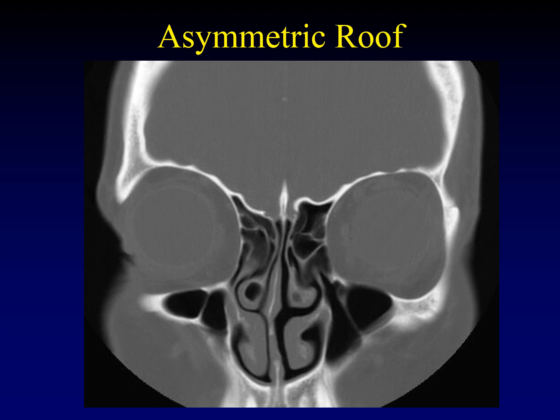Another important thing to discuss is how shallow or deep the cribriform plates are. That is, how much distance is there in the lateral lamella. You can see on this side there's essentially no lateral lamella, so that's a shallow cribriform plate. How shallow does it need to be? Well, there's a little bit of subjectivity here. If you want to be more objective, you can use the Keros classification scheme, and your cutoffs here are less than 4 millimeters for a shallow cribriform plate, greater than 8 for a deep cribriform plate, but I find that the subjective analysis is usually sufficient.